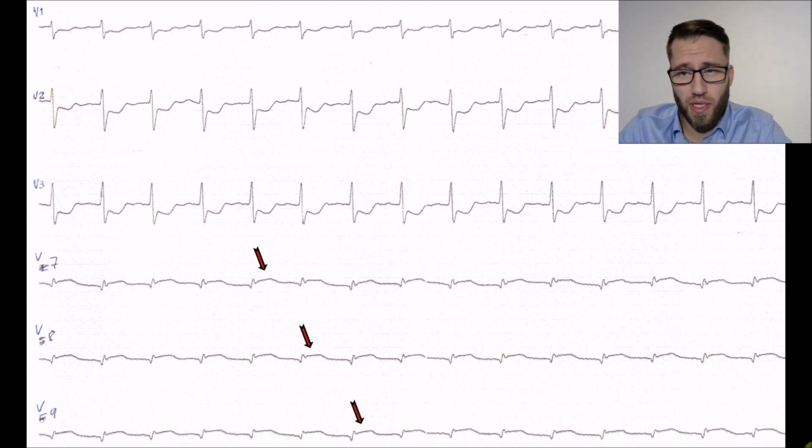And this is important because if you don't have these leads here, you would call that maybe some ST depressions here in the anterior chest wall leads. We will wait till the troponin shows us what is going on. But if you do these leads very quickly in the emergency department, in the emergency room, you will have a very fast diagnosis of STEMI there, and you can save precious time getting the patient quickly to the cath lab.